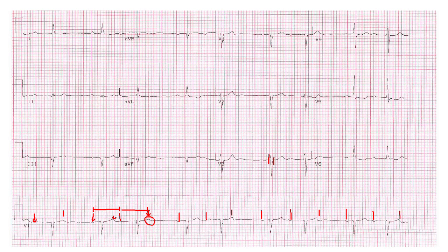So I therefore don't have a QRS complex for every P wave. And then the other thing I'm going in through here to see is that my PR intervals are changing. So I've got a fairly prolonged PR interval. Remember, your normal PR interval is less than 5 small boxes or 200 milliseconds. So it should be between 120 and 200 milliseconds, which is 3 small boxes to 5 small boxes. So I've got a very prolonged PR interval here.